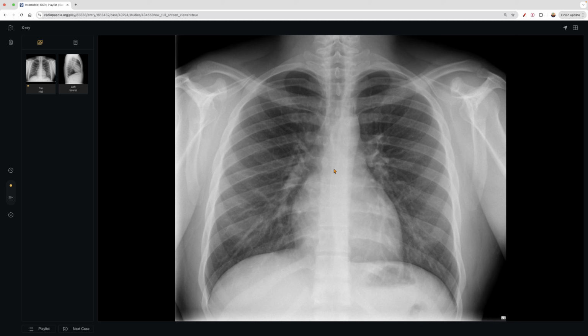I personally don't like that approach for my own self going into radiology. I would prefer going outside in. So I like to look at the outside structures, something that doesn't require too much, not going to say effort, but when our main image and focus is here, I want to get these out of the way. So I look at this first, and then I come down and I go back up systematically with my eyes. Then I always check the costophrenic angle here. And then I go across the diaphragm, and then bounce back up and down. Then I'll go from the trachea and zigzag across, look at the structures, look at the mediastinum, and then check out the heart. That's the way I prefer to do it.